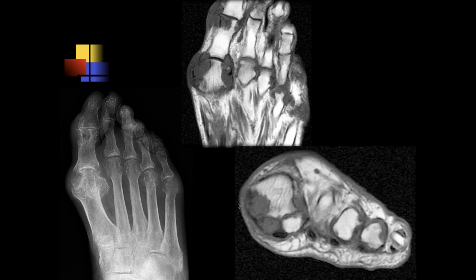Okay, Jennifer. Okay, so here we see erosive changes at the medial aspect of the first metatarsal head and also erosions along the distal aspects of the proximal phalanx, and other erosions throughout the other metatarsals. I guess this could be gout, or it could be erosive osteoarthritis. Yeah. Notice that what we see of the joint space looks pretty normal. Yes. We just see these erosions, and this was gout.